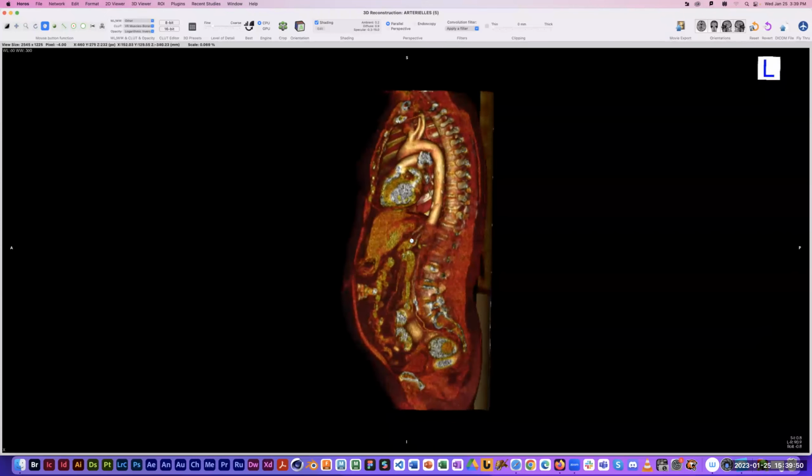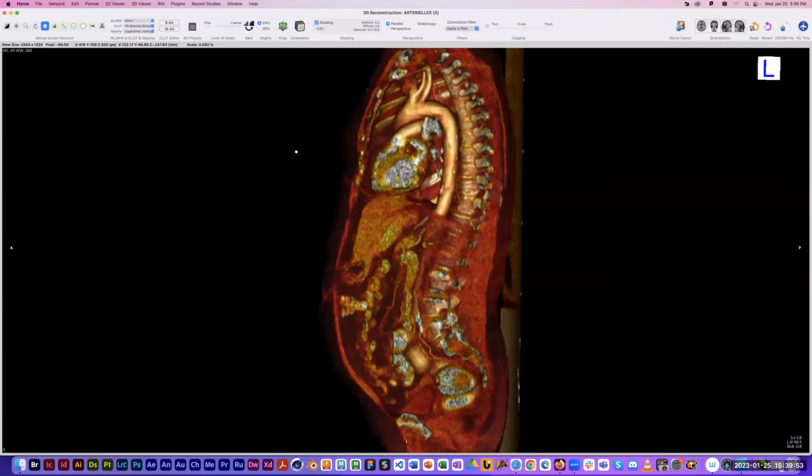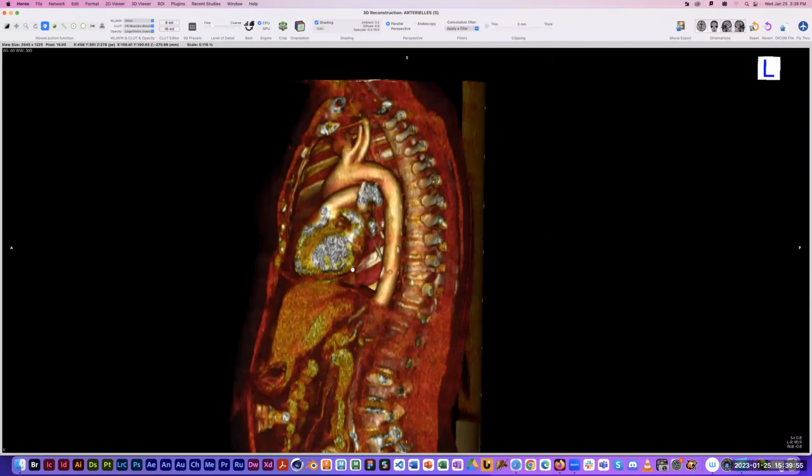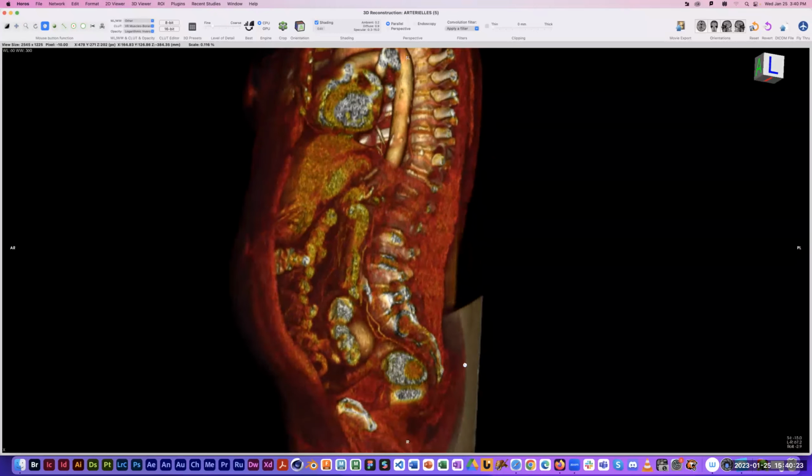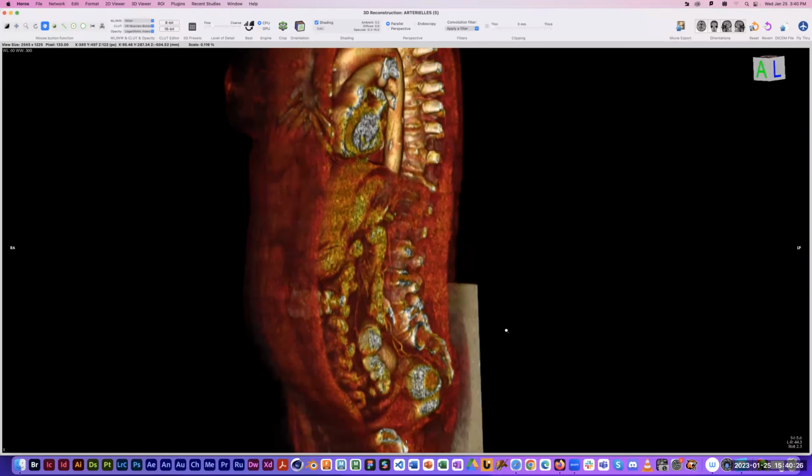And I think this is pretty cool how you can now, by cropping away the rib cage on the left, look in and actually see that the heart is partially cut also. And then you can clearly see pulmonary trunk coming back from the right ventricle, aorta coming up and into the aortic arch. And you can see some of the major vessels coming off the aorta, and then see the descending aorta dropping down, and see things like liver and different parts of colon and so forth in here. So we can rotate that around.